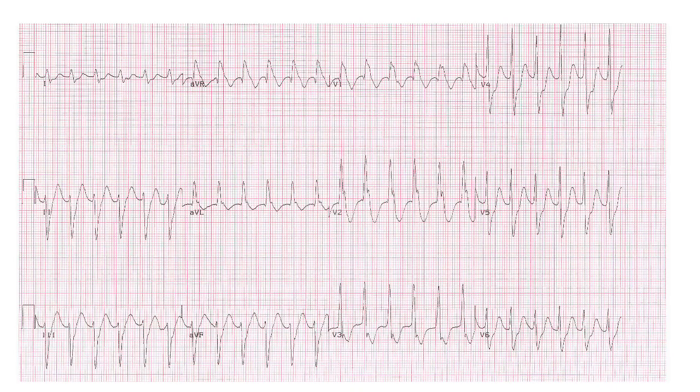So here's another example EKG. And on this one, notice there is no rhythm strip. We just have the 12 leads represented on this EKG. So if I'm taking a look, my two big questions at a first glance in terms of rhythm: is my rhythm regular? Yes, if I were to measure and march out the R to R intervals between each QRS complex, they would be the same. So this is a regular rhythm.